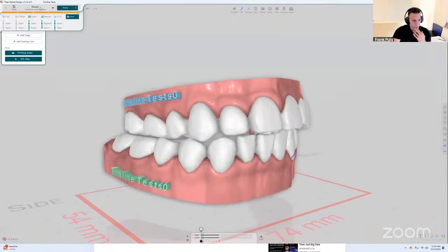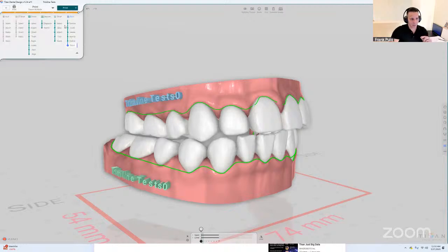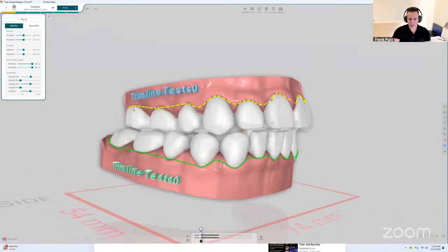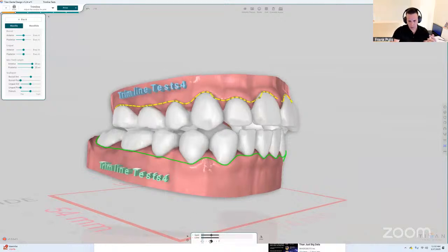If you go to the Trimline step, which you can also reach by clicking on the STL file and clicking Trimline, we have improved the way it works quite a bit, to be more smooth and to have more customization regarding the anterior and posterior teeth. The idea of the Trimline is to be fast, so that as you move, it will update the Trimline for every aligner based on the teeth movement, and it will allow you to customize it.